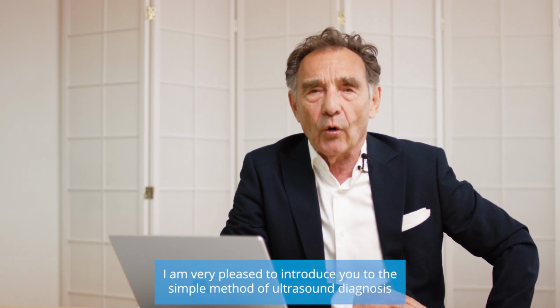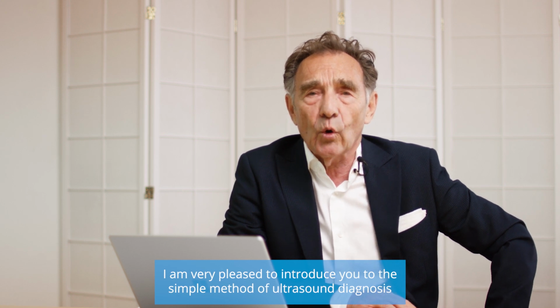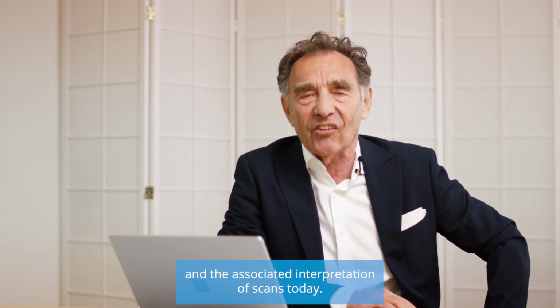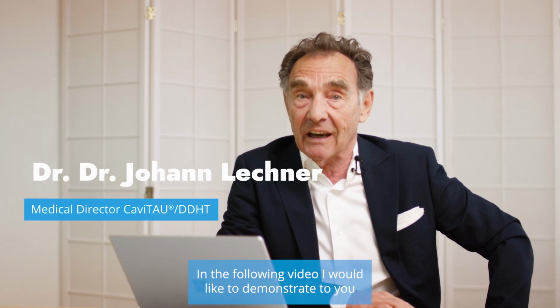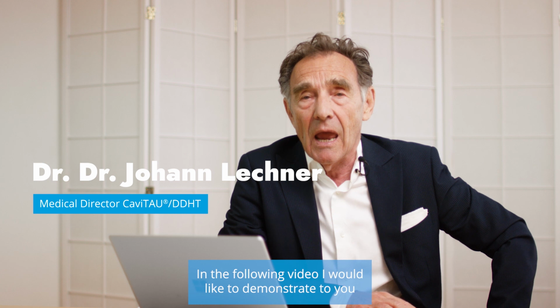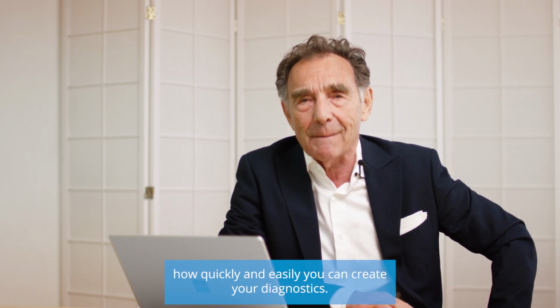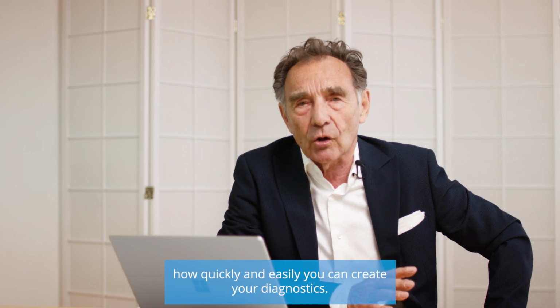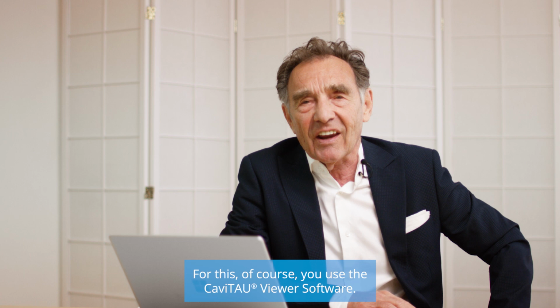Dear colleagues, I am very pleased to introduce you to the simple method of ultrasound diagnosis and the associated interpretation of scans today. In the following video, I would like to demonstrate to you how quickly and easily you can create your diagnostics. For this, of course, you use the CaviTAU Viewer software.